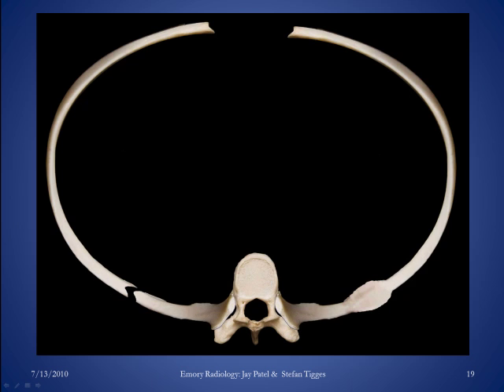And on the next slide, we see a fracture formation on the right side and an old fracture formation on the left side with adjacent callus formation. And I'm talking radiographic left. I'm speaking like a radiologist. So this would be, to me, my left, and this is on the right side. You get the picture.